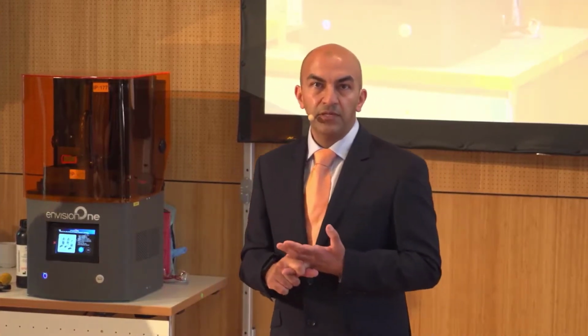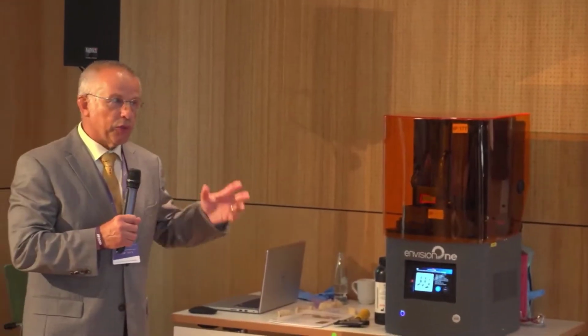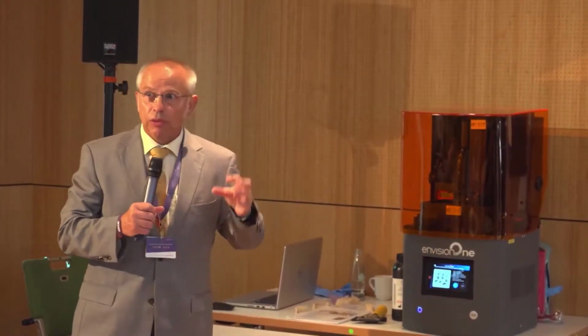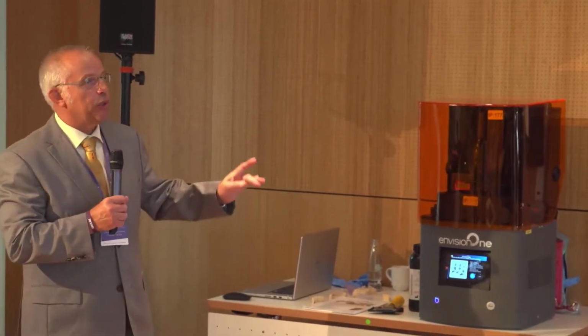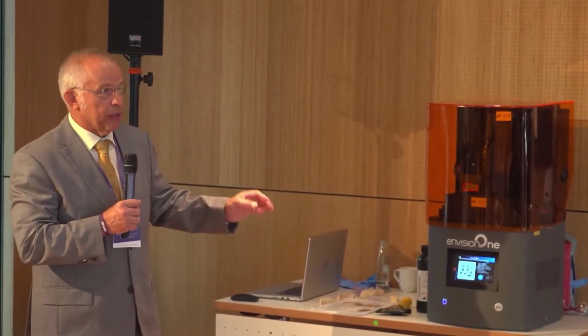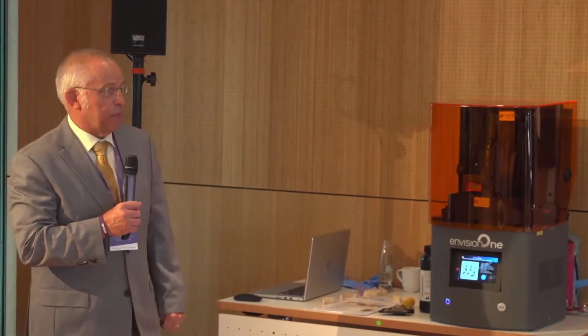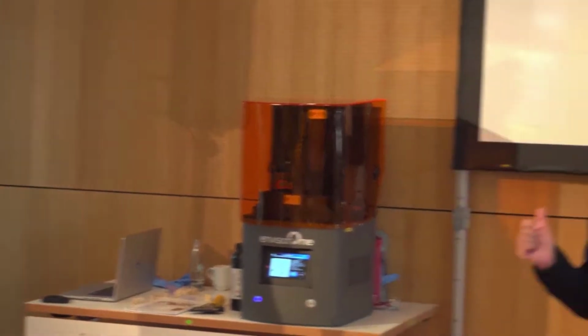It's vitally important that the resin that your printing partner uses is one that's CE marked if you're in Europe or FDA cleared if you're in the USA, so that it's a device that's safe to use in the mouth. And you cannot just take any way of doing with this machine or with that resin. You have to stick to those regulations, and very important, you can also sterilize this. This is very, very important because you are in surgery in that position. Brilliant. Udo, thank you very much.